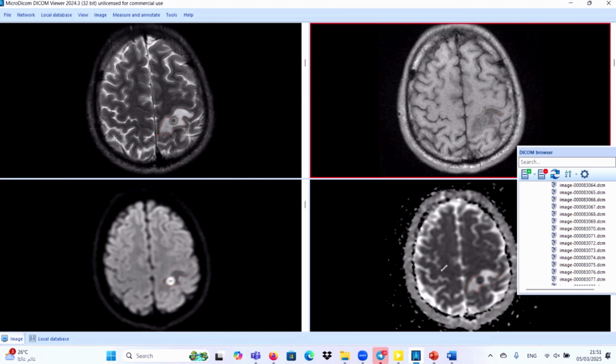Regarding the lesion itself, it appears bright in the diffusion in spite of having a dark dot of iso-intense signal at its core, but the lesion almost shows a black hole in the ADC map, so it is considered restricted diffusion.